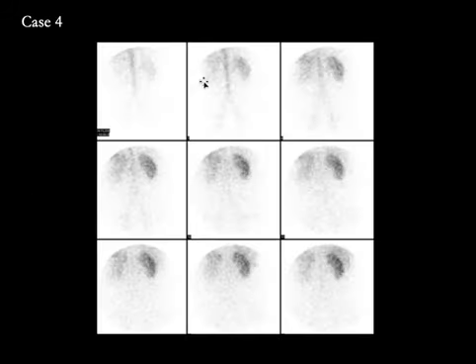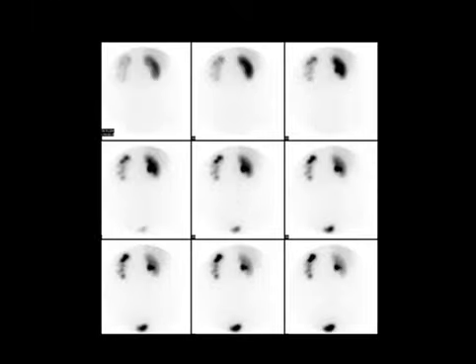Another patient where the blood flow is slightly compromised on the left compared to the right. In terms of renal function, the kidney takes up the tracer, but in a very patchy fashion compared to the right kidney, and not as much tracer uptake is seen in the left compared to the right. It produces some radioactive urine, but there is no collecting system activity. At the end, we find that the right kidney has emptied normally into the bladder, but the left kidney does not show any excretion of the tracer.